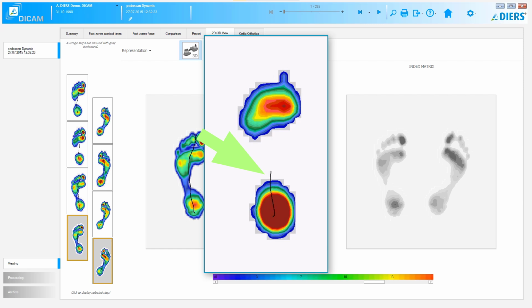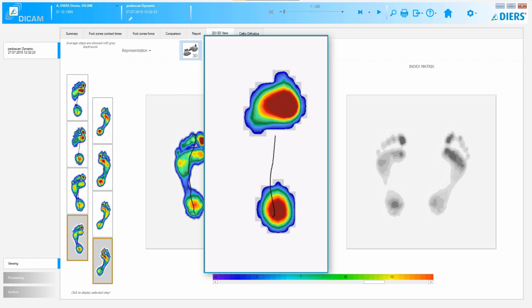From this point, the COP line bends medially, resulting in a shift of pressure development in the forefoot also medially. Increased eversion at this stage has an essential compensatory function in mitigating the eccentric stress on the hip abductors at this stage, as it ensures that the transfer point of the ground reaction force is positioned closer under the body's center of gravity through medialization.